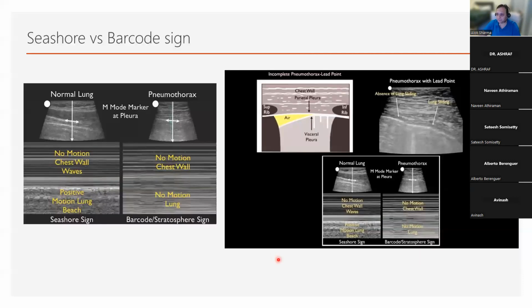It's not common. Now, what is important from your perspective is that whenever you have air and an A' profile, you will obviously have air that will accumulate. If it's a small pneumothorax, you'll have anterior air, but lung laterally will be clearly visible. Because of that, you will have a point of transition where, when you use M mode, you have normal lung and a pneumothorax. And that area of transition is what we call the lung point.